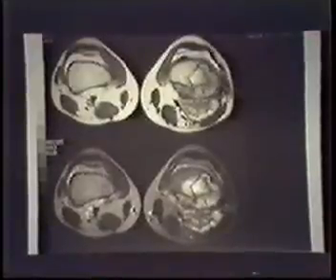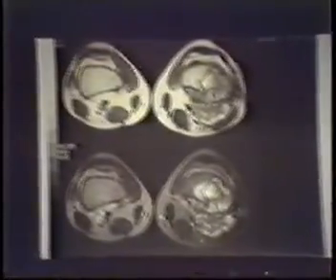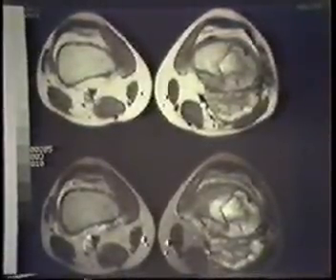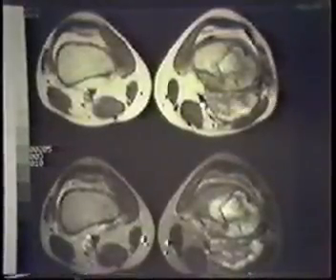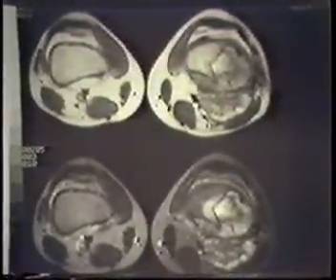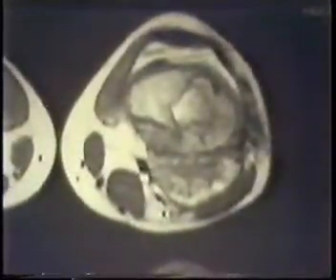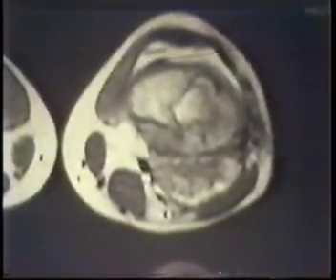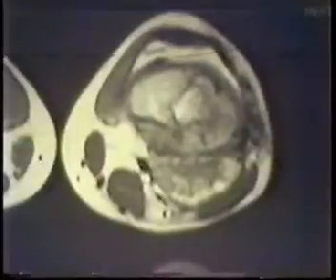Just very briefly, bone tumors. This is an osteoid osteoma, just to see what they look like. Typical symptoms. There's generally a little bit of inflammatory change in the soft tissues around these. And just for completeness, osteogenic sarcoma. The great thing about MR, as everyone knows, is that it's the best study for determining intramedullary spread. It's the best for determining spread in the soft tissues. It's the best for determining whether or not the neurovascular bundle is involved and how many muscle groups are involved. And basically, in any bone tumor now, before radiation therapy or limb salvage surgery, MR is mandatory, I think is the bottom line, and very few people.